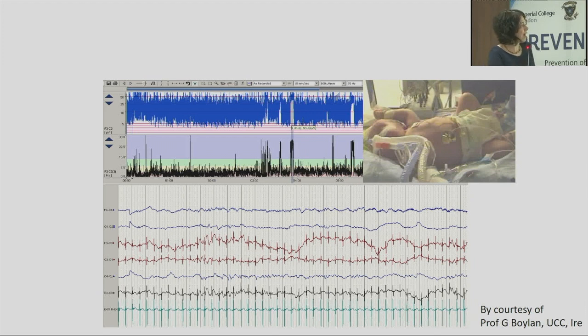And this shows how important the raw channels are. So for the PREVENT study, we'll give you the aEEG, but also 2 raw channels, so that you would be able to see whether an electrode had become loose, or whether there's an artifact, or whether there's actually seizure activity.